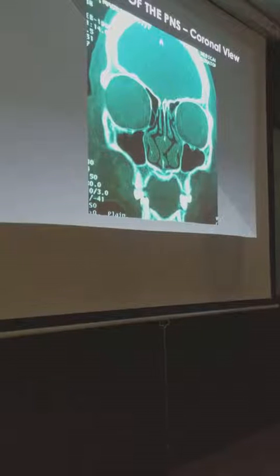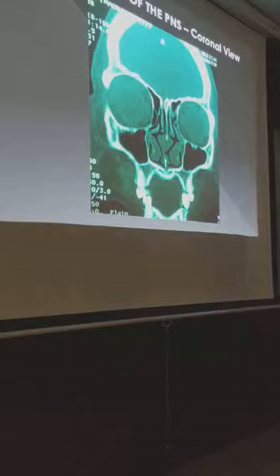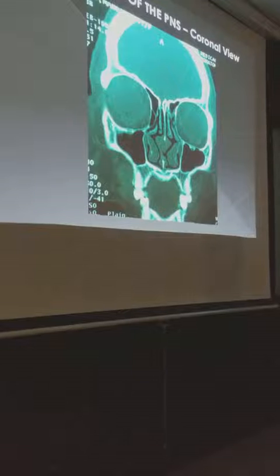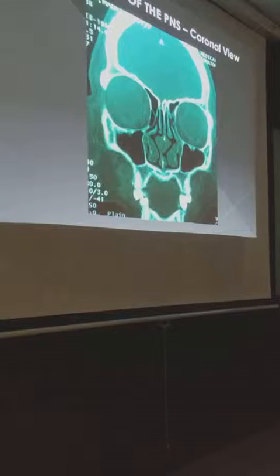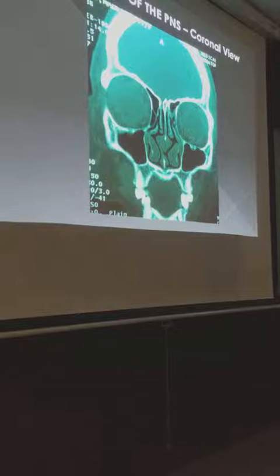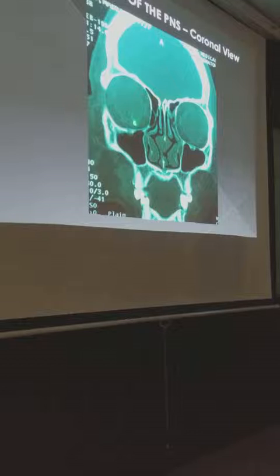Now, behind the bulla, between the ground lamella, which is your third lamella of the primary, and the bulla would be what? It will be a retrobular recess. Alright? Retrobular recess. Collectively, the suprabular recess and the retrobular recess are called what? Sinus lateralis. Okay? And we will go back to that later on. So, alam na natin yan yung cell.